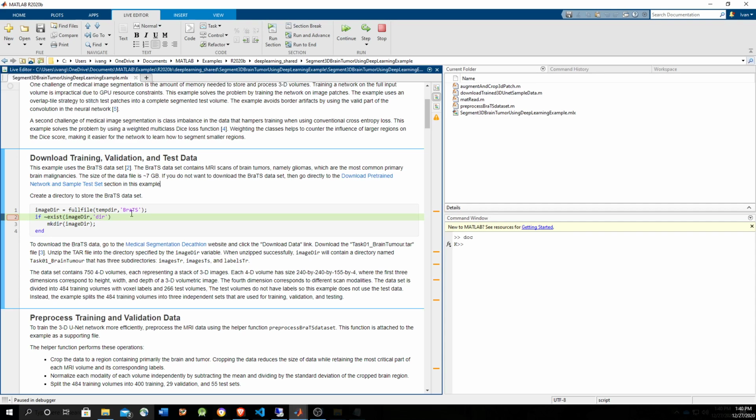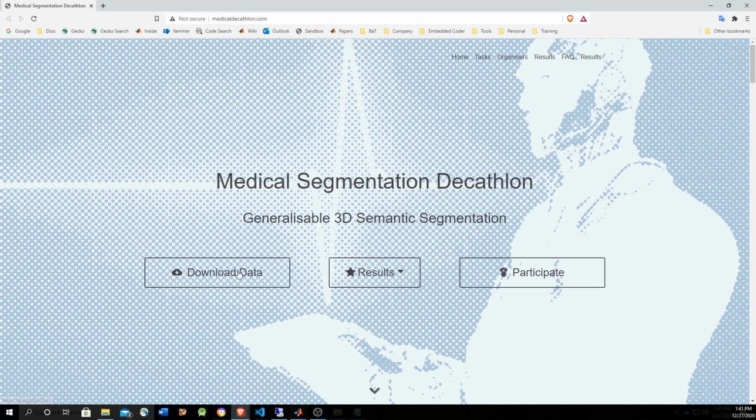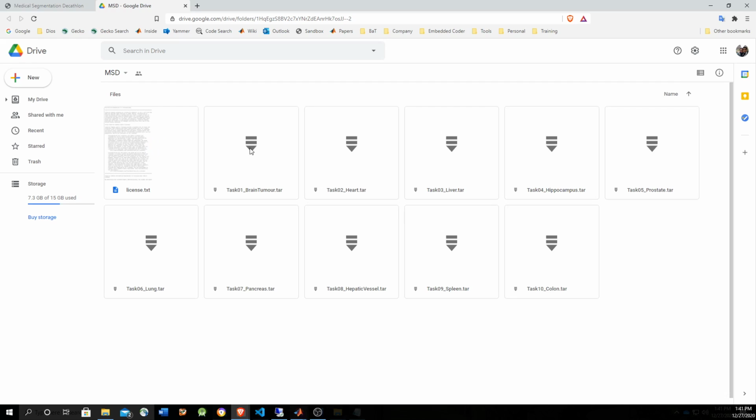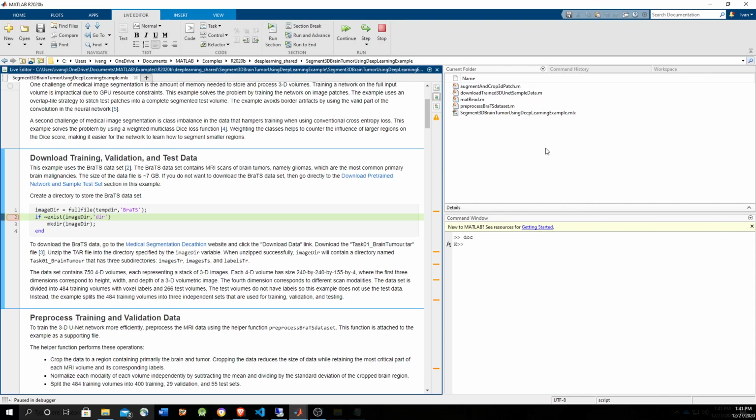Okay, so the data is going to come from this website. It's going to be here. You go to the corresponding Google Drive and select this one and download it. And I'm not going to do it now because it takes a lot of time. So in the end, you're going to have something like this.